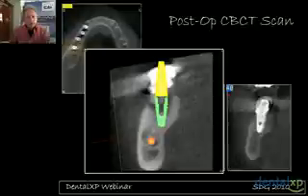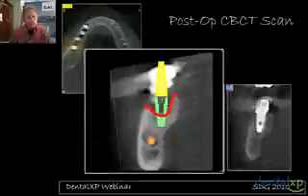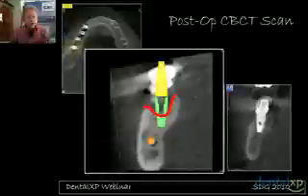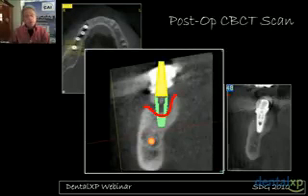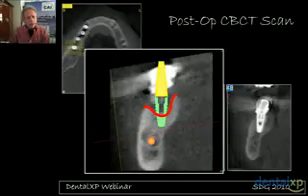When we start to think about the initial plan, and we go back to it, we can see the amount of bone that was missing. In this case, we grafted first. So sometimes it makes much more sense to graft than to go in and just haphazardly place our implants, because we're trying to get them in and not place them into a good receptor site. Let's manage the receptor site, come back later. Patients will understand. Not everyone's in a hurry to get their work completed.